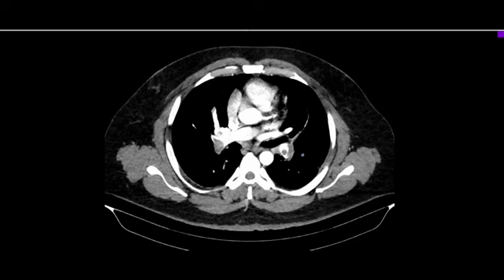And finally, you can also see some bronchial or systemic collaterals in a case of chronic thromboembolism. This is the temporal classification. Third is the hemodynamic classification, for which you have to give a clot load score, in which what do?